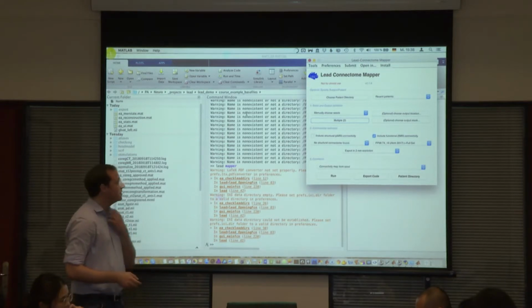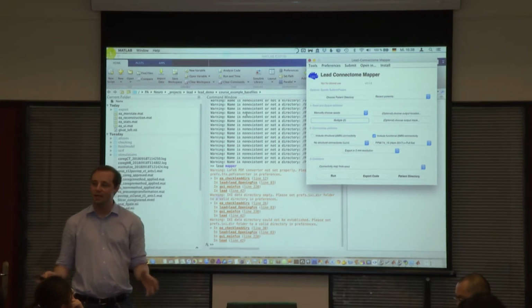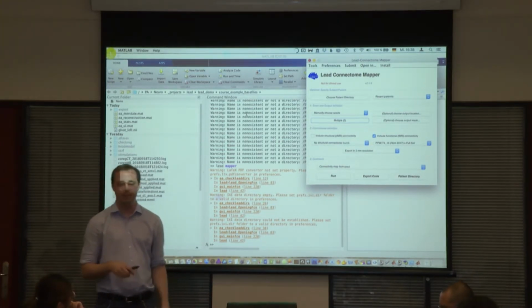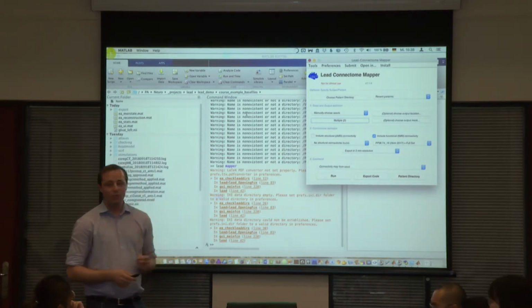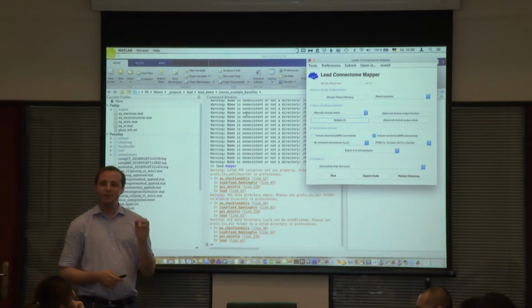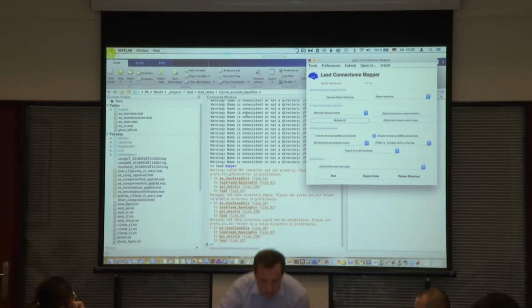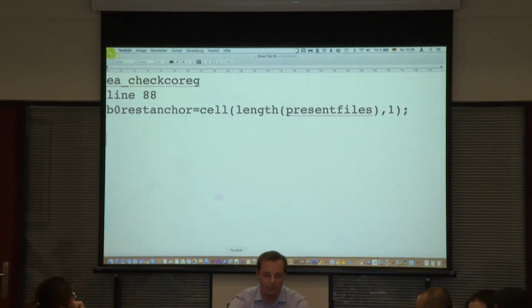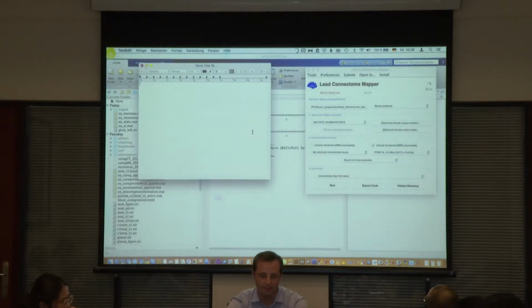Now I could also take anything else instead of a VTA. I could just say, I have a hand-drawn lesion of your tumor or whatever. I could just select that, right? And what's important here, I could also import a text file. So I could make a text file which points to certain NIfTI files, right?